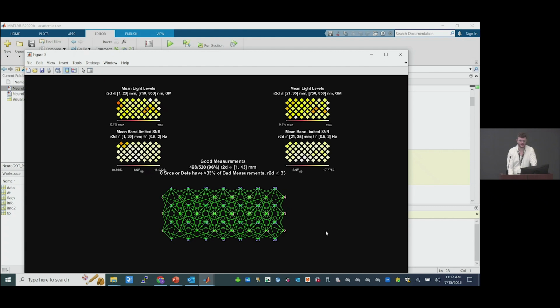It helps from a cap adjustment standpoint. If this optode is messing up on multiple participants, then I know my system might need a little bit of tweaking just in that area. Whereas if it's just for one person, yeah, Mike?